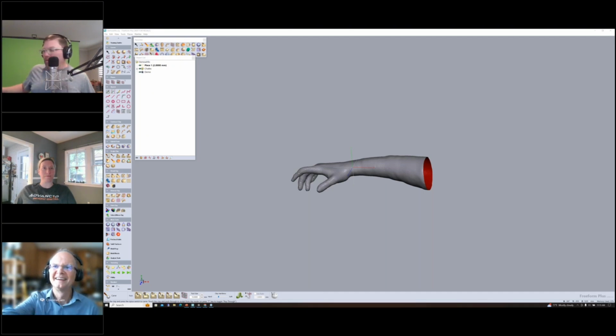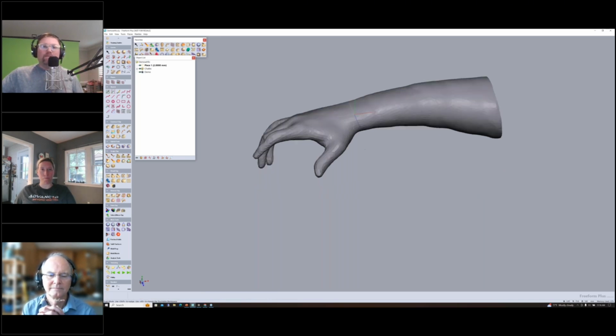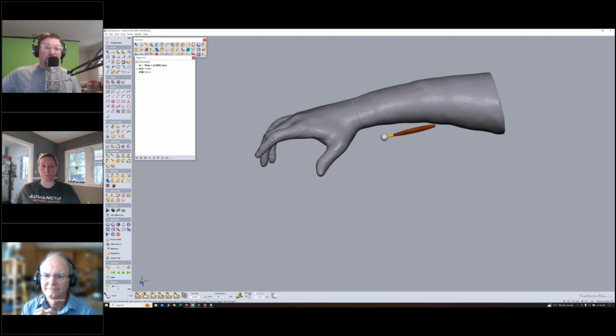Okay. The idea of this is not necessarily the final product of what a WHFO is, but really it's about paying attention to the tools and how those tools transfer and build on each other. A wrist hand orthosis is essentially one of the most basic devices that you can make. I'm going to take you through the manual way to do it. We're going to talk through it. It's going to take a few minutes. But I want to reiterate, this is the manual way.